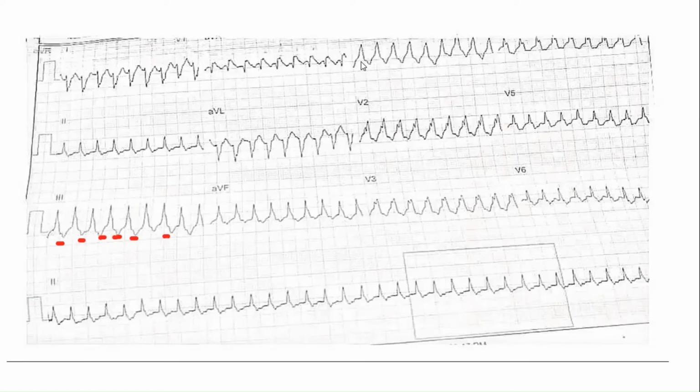So in the case of antidromic, the QRS morphology will be broad, but it will be atypical. Now you see, does this look like an atypical right bundle branch block? This is a typical right bundle. You see, a good M, RSR pattern is being formed. Ignore V1, but look at V2 and V3. They show a very pretty good right bundle, which looks like physiological conduction down the left bundle, because the right bundle is blocked. So it was a 1-to-1 tachycardia. So VT is unlikely. Now the differentials will be SVT and antidromic.